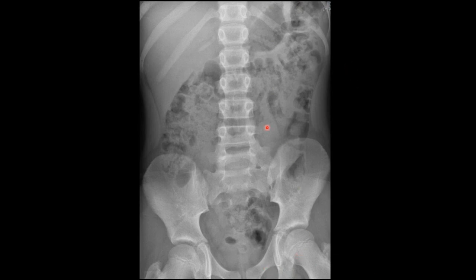What we want to do first, I always say with abdomen, the only things that we can talk about are bones, stones, gas, and mass. Those are the only things we can really see. I tend to look at the gas pattern first. So we see here we've got the cecum region of the colon. How do we know that this is colon? Because it's got a wide radius of curvature. It's got these thick haustral folds, and it's quite wide, and it contains fecal residue.